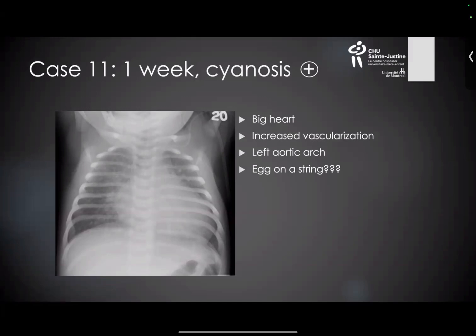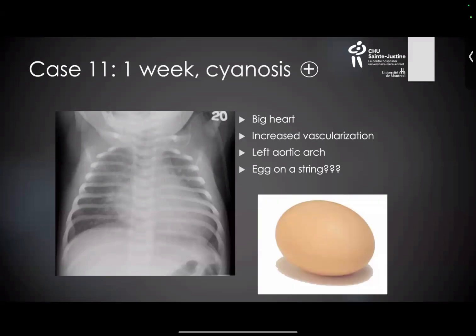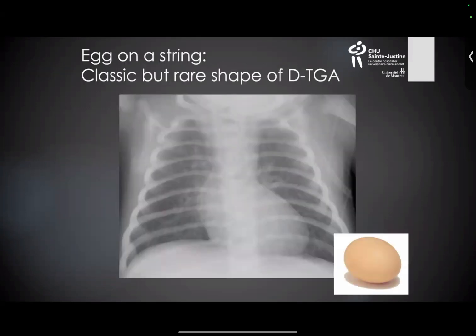Is it an egg on a string? I'm not sure. But in that case, it was transposition of the great vessels. So this is the most beautiful egg on a string I saw in my career.